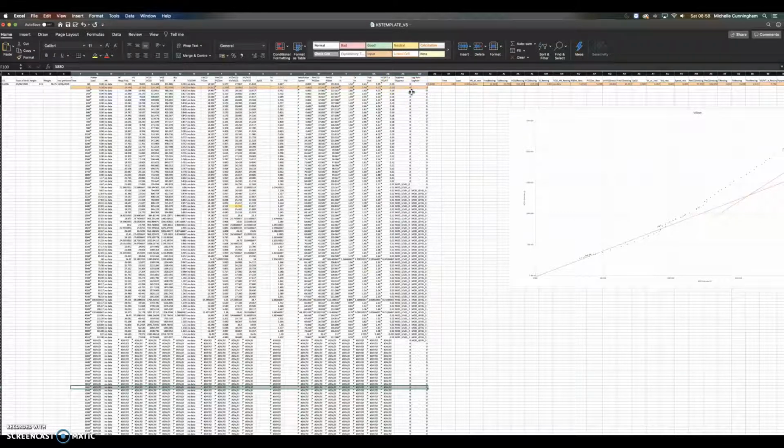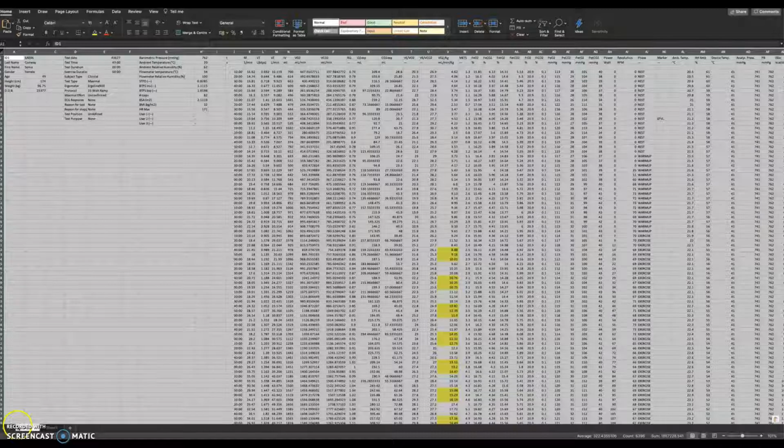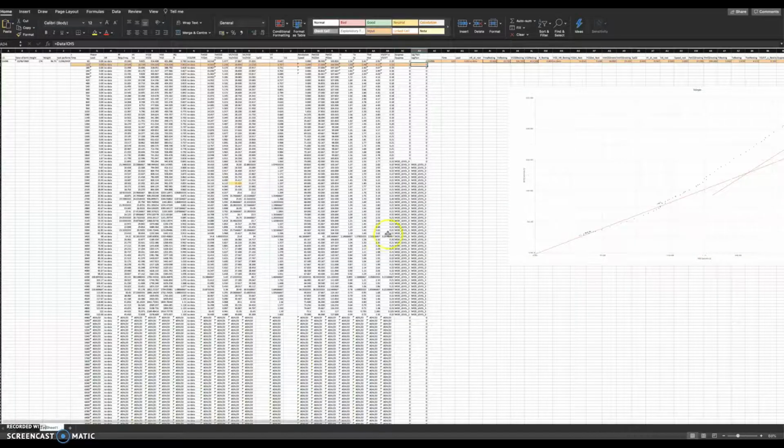You'd see that being slightly different if, oh, hang on, sorry. I just made one slight change there because something wasn't coming through correctly. So anyway, back to sheet 2.